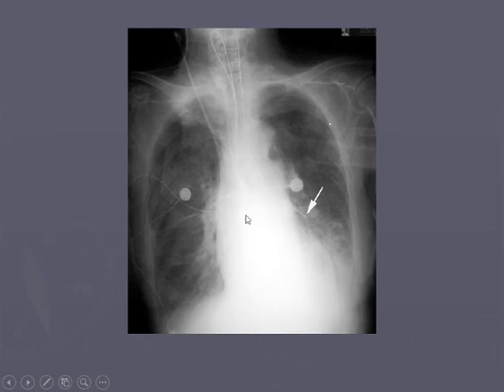So we have our cardiac shadow there. There's a pulmonary artery there. If you take into consideration his skewedness in the bed, that looks about right. But he does have a bit of vascular congestion there. Here's our horizontal fissure. That's right across like it should be.